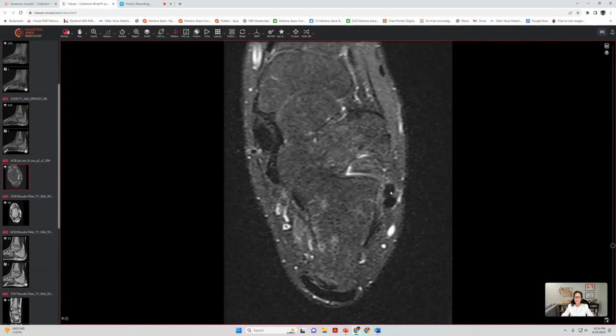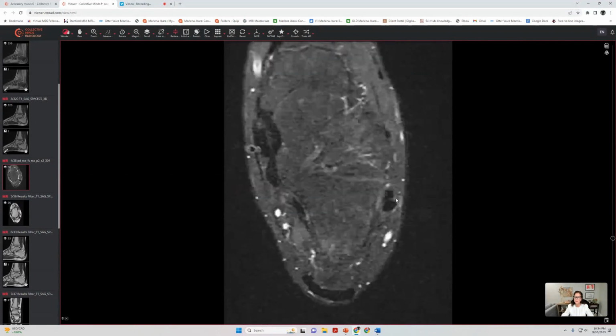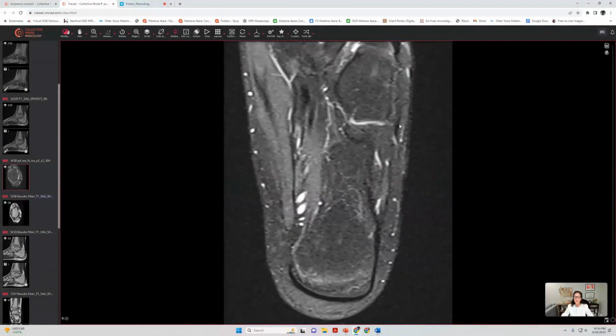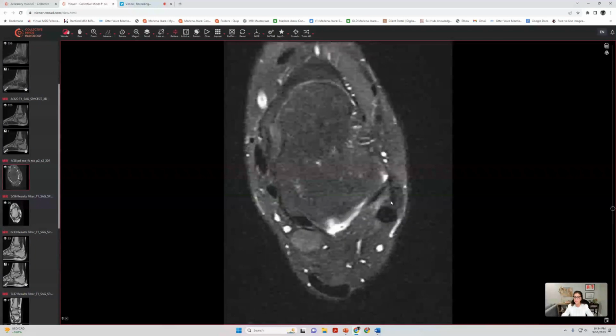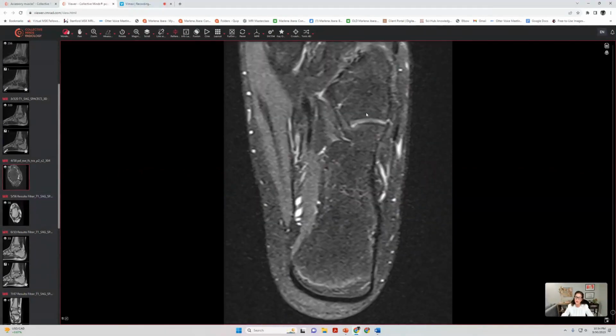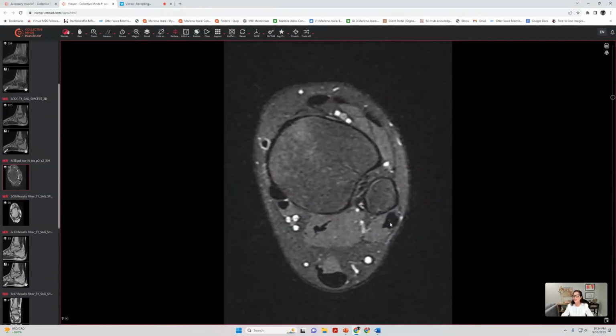The peroneus brevis we can see on the axial image along the inframalleolar groove. That's the location just after the lateral malleolus to the base of the fifth metatarsal where it will attach. And of course, we can see the peroneus longus will move on to go at the undersurface of the cuboid tunnel. So there's a lot of anatomy seen on axial image.